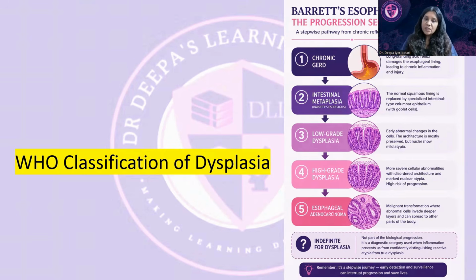Negative for dysplasia is a non-dysplastic Barrett's esophagitis in which the epithelium shows intestinal metaplasia with goblet cells. You may see some mild nuclear enlargement. The basal portions of the gland may sometimes show some mild atypia. But the surface epithelium is absolutely normal. Nuclei remain basally located and glandular architecture is completely preserved. Then call it no dysplasia.